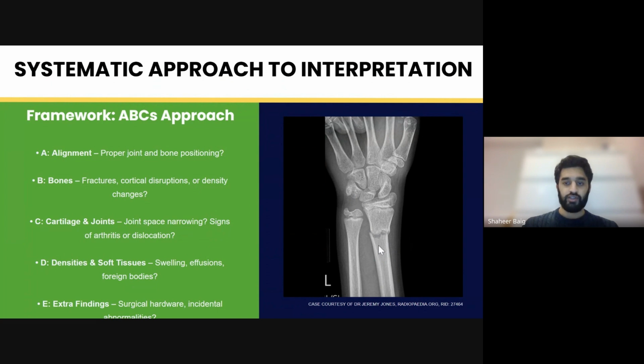You can clearly see the trabecular bone changes in density from the normal to the fractured cleft, which is much lower in density, or darker on the X-ray. You can also assess the joints, less so the cartilage, but we can see the radiocarpal joints, the distal radioulnar joint, and also the carpometacarpal joints on this film. That can give us an idea of any dislocation, any joint degeneration, or just general narrowing.